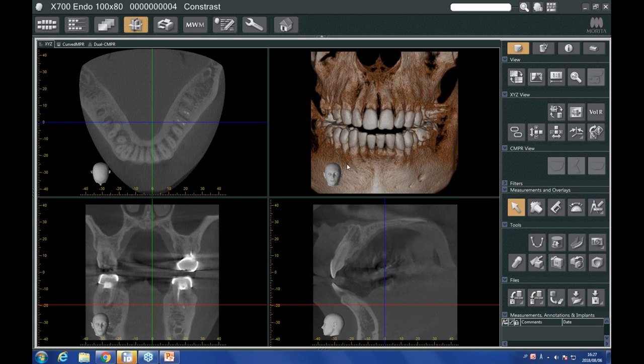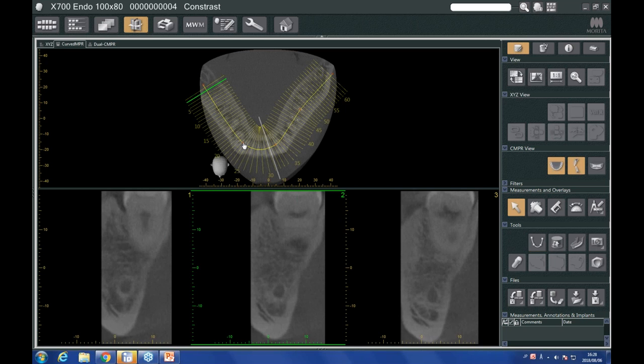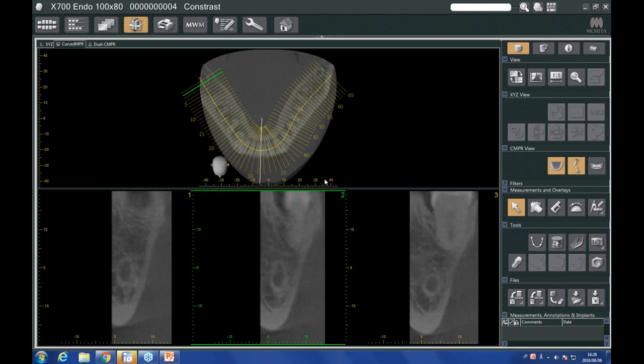So this way we can set up templates within our printing software and then just generate that report at any time. So I'm going to use my spline tool to draw a spline again. And you can see these small dots along here. Those dots allow me to modify the spline after the fact. I can just grab them, make them a little longer, adjust it as I need.